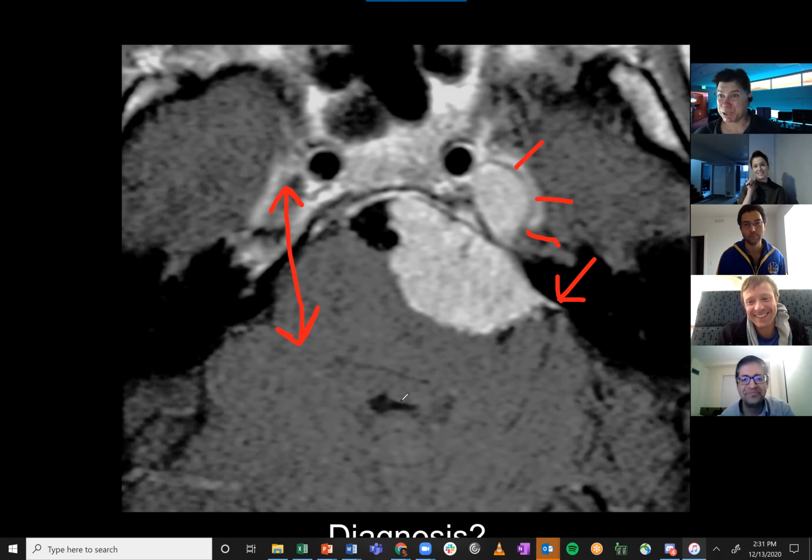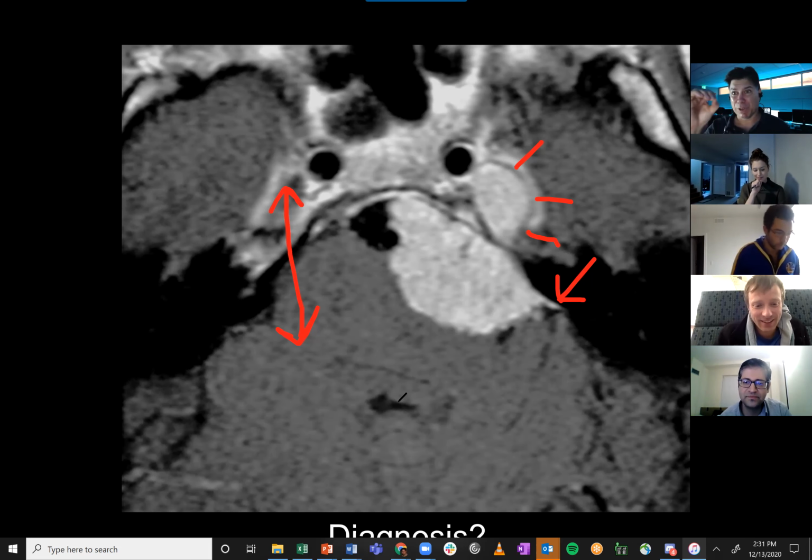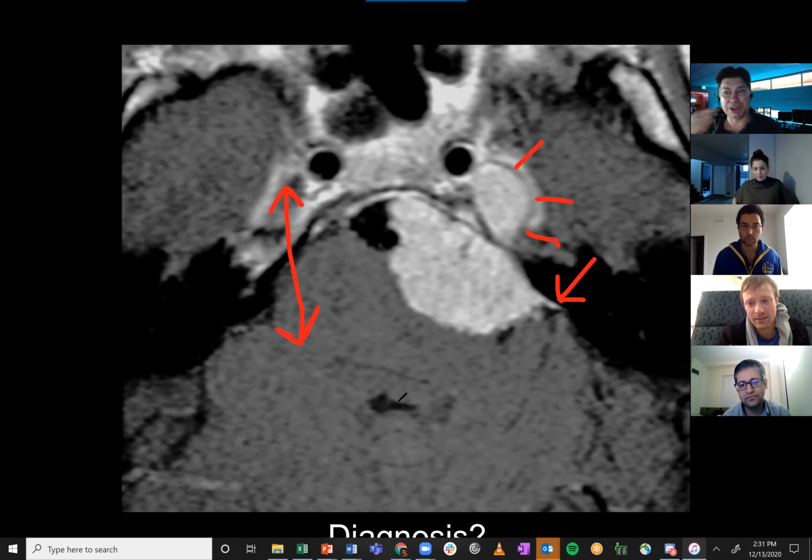Probably not, I'd say. They can actually. So if a meningioma with that dural tail goes along its dural base and goes over a foramen of the skull base, it may go down through the foramen. So you can actually have meningiomas that show up as a masticator space mass that may extend down along that area. So extraaxial dural base mass, it has dural tails.